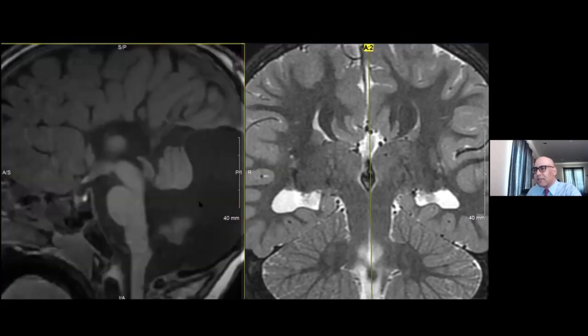So this patient has a classic Dandy-Walker malformation, but also agenesis of the corpus callosum. The constellation of findings definitely warrants further evaluation with genetic testing. In recent years, we've learned that one class of abnormalities that can result in this combination includes abnormalities of the tubulin gene, or tubulinopathies. So this patient may benefit from a genetics consultation and evaluation for abnormalities such as a tubulinopathy.